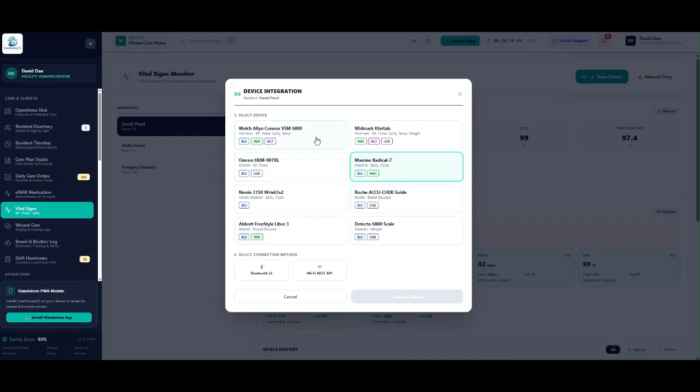And also the different devices have their limitations, what they can measure. As you can see here, we have one that can measure more than the other items that are here. This one can measure both the weight. This one can measure all other things except the weight. And some of the rest of these ones can measure like 2 or 1 vital signs.